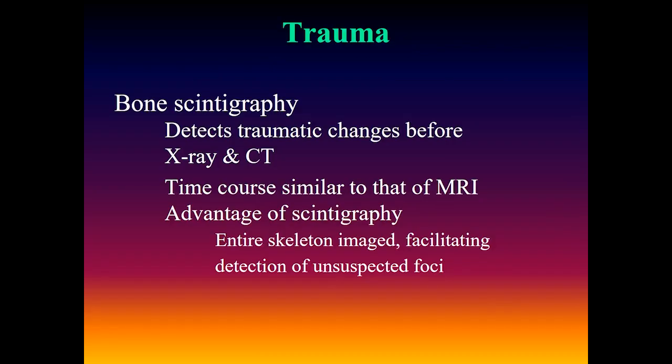Bone scintigraphy has long had an important role in the evaluation of trauma. Bone scan detects traumatic changes sooner than X-ray and CT. The time course is similar to that of MRI, but an important advantage of scintigraphy is it permits imaging of the entire skeleton, thereby facilitating detection of unsuspected foci.